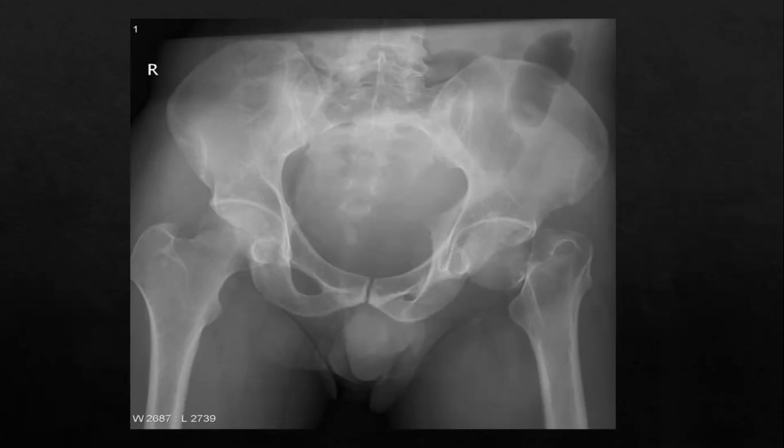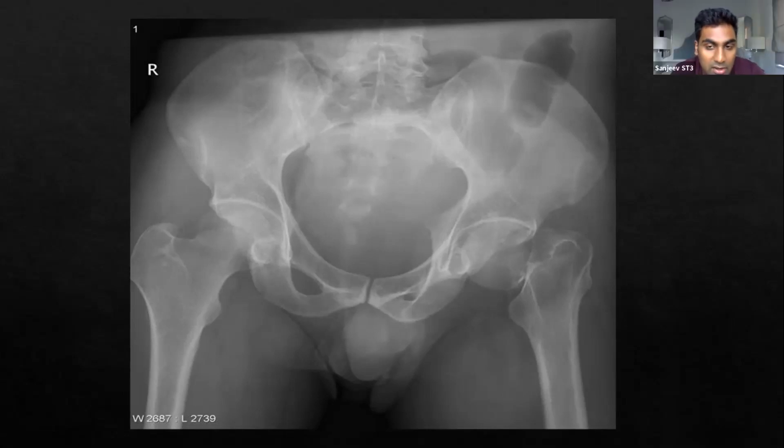And in terms of management, radiologically, what would you like to do? So depending on the patient, I would either do a total hip replacement or a hemiarthroplasty. So depending if they're independent or not independent at all in their everyday lives. Lovely, yes. That's right. That's how you'd manage the hip fracture.